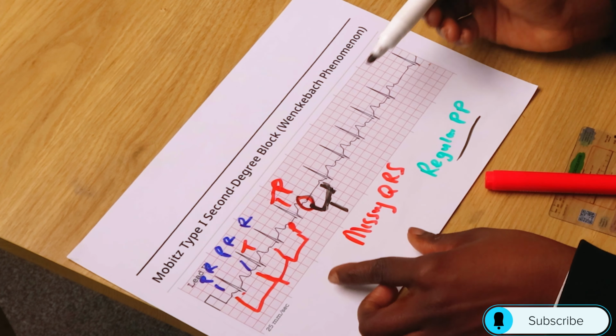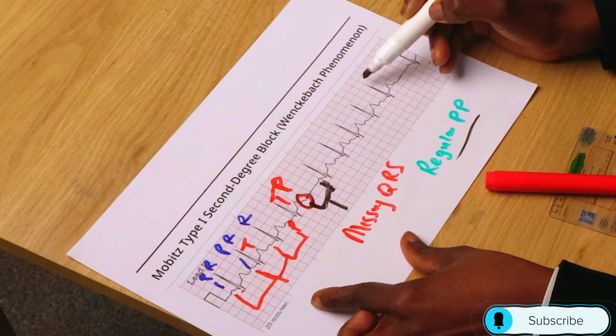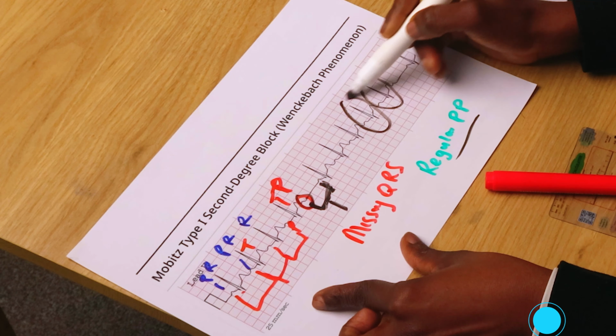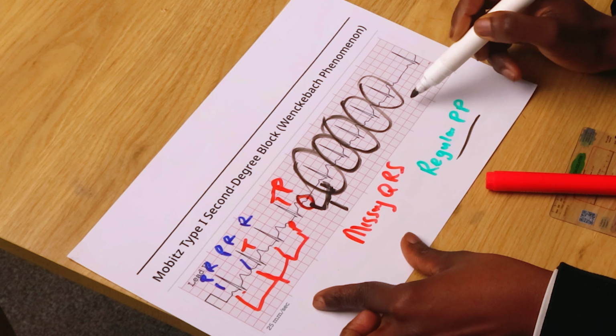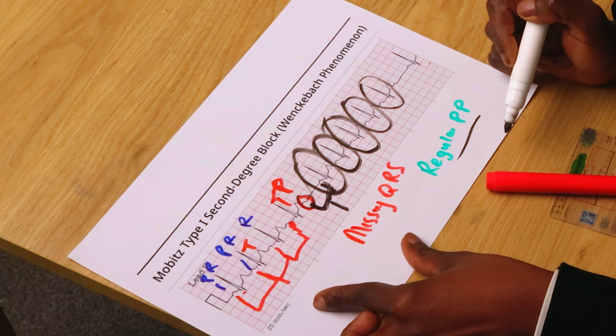Now let's look into practical examples here. This is something I also wanted to flag up. We could use this first one. What you will find here as well is that you can count in each cluster, how many QRSs do you have? 1, 2, 3, 4, 5. So you have 5 QRSs, but how many P waves do you have? You have 1, 2, 3, 4, 5, 6. And some will call this a 5-to-6 ratio.